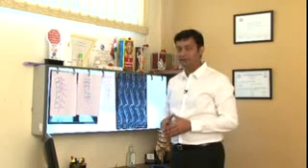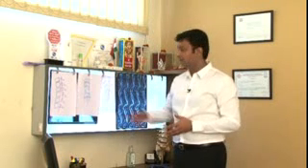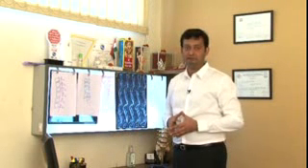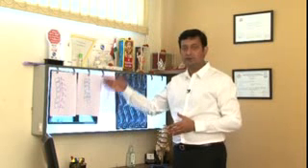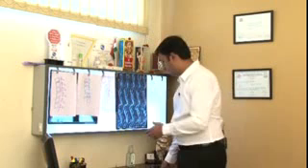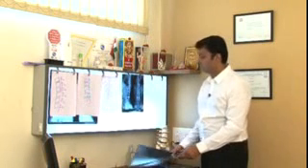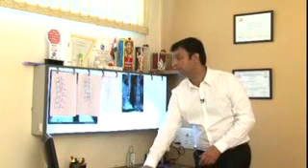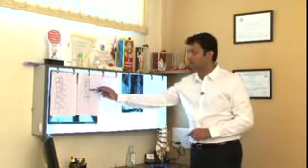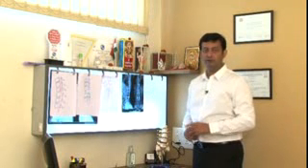These are the lower vertebrae. This is the spinal cord which is now made free, and this vertebral column is supported with the help of a posterior pedicle screw construct. This column assembly, what we can see here, is very well documented on X-ray in this form. So if you see here, this is what we drew, this is what we explained to the patient, that we will do this procedure, and this surgery was performed for Shubham Kashid.